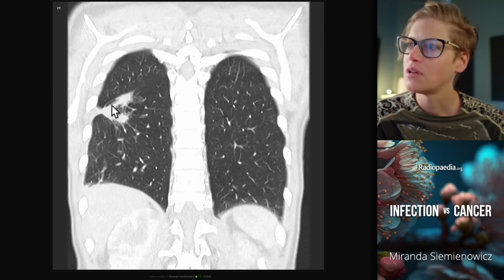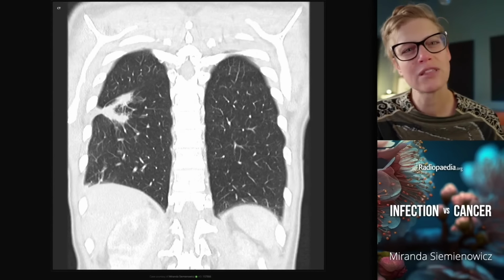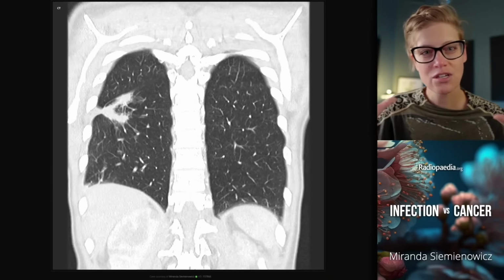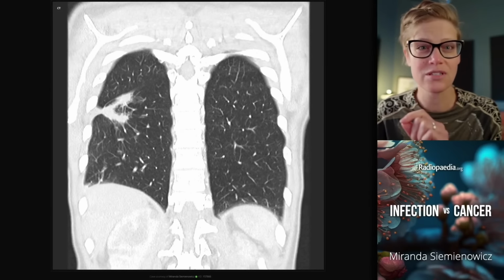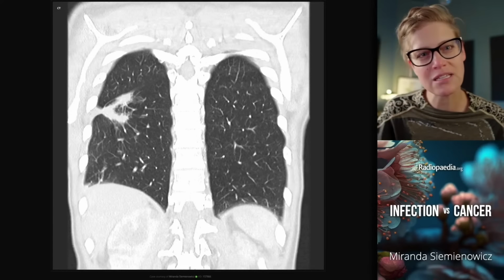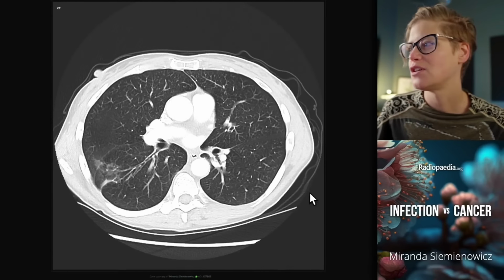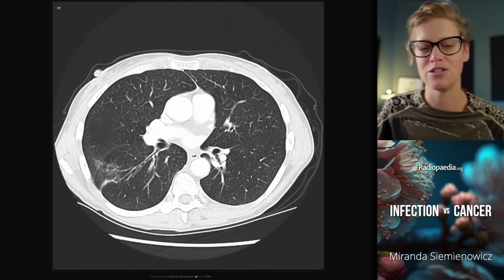Remember those. The pleura is being pulled down. Is it tethered? Is that a worry? People get excited about the pleura. They think about pleural tethering as being a sign of malignancy, but I'm here to show you that as inflammatory lesions become retractile and organized, they will move the pleura. They will move the fissures. And that kind of fissural tethering is not a specific sign for malignancy, and we see this in inflammatory lesions all the time. We follow this lesion up a few weeks later, and it's resolved. So this is infectious, post-infectious organization, and a resolving benign lesion.